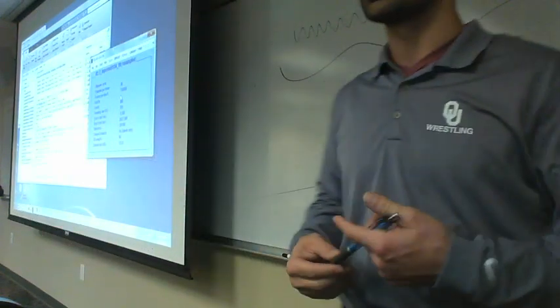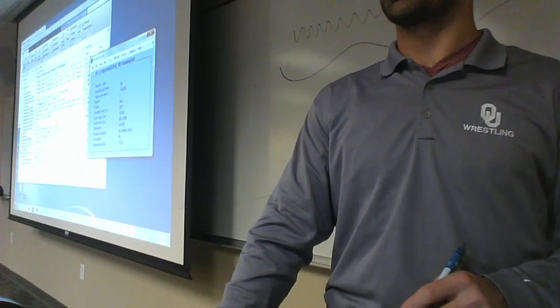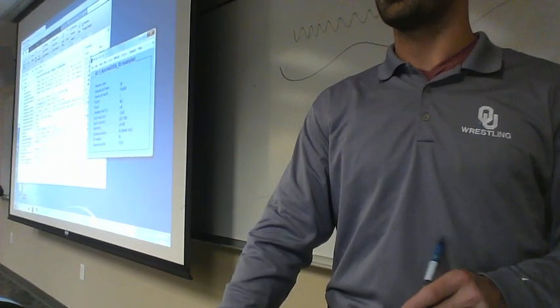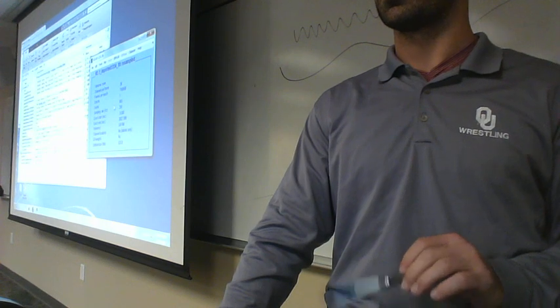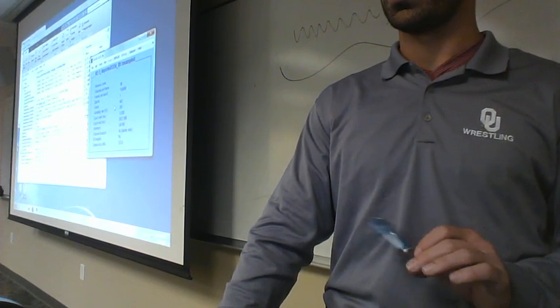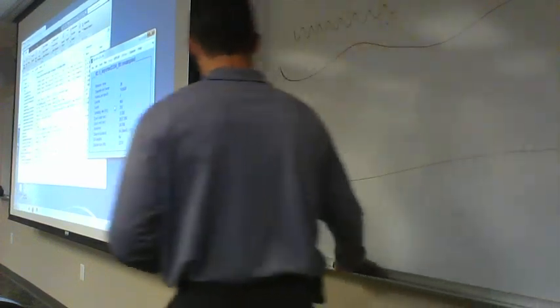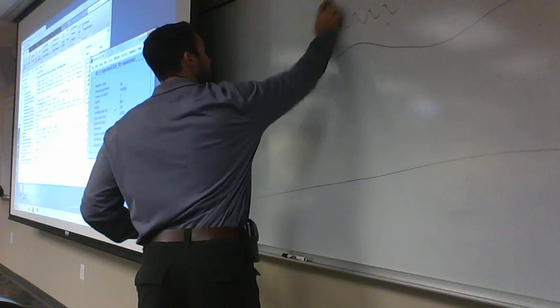So what we want to do is slice it into our 300 trials. Now we have 900 events. One thing we can do, this is a good time to actually talk about what our experimental paradigm is.